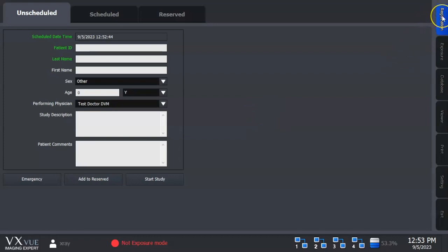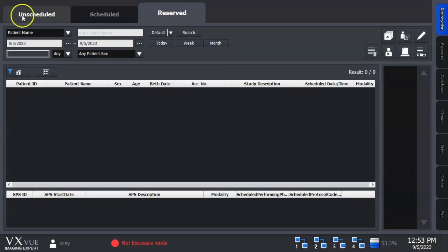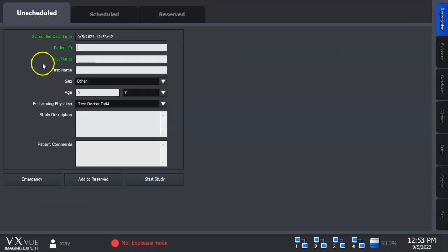In this video, we'll cover the registration tab and functionality of VXVue software. There are three subtabs: unscheduled, scheduled, and reserved. We will begin with unscheduled.